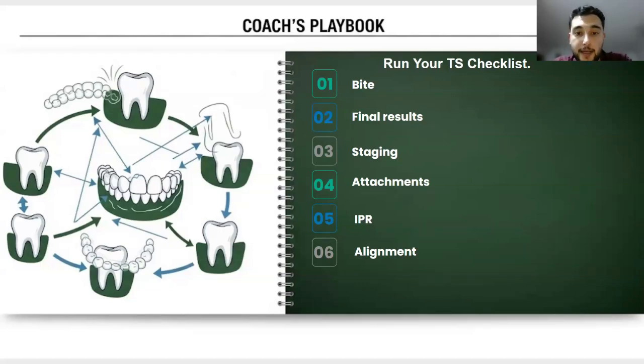And I know this might not make sense right now, but once I go with you systematically over how to review a treatment setup, you're going to understand the most optimal way to go over your plan. Of course, you can change the order and play around with it. This is the way that I've found most effective, so as not to miss anything in your treatment setup. You go by this order.